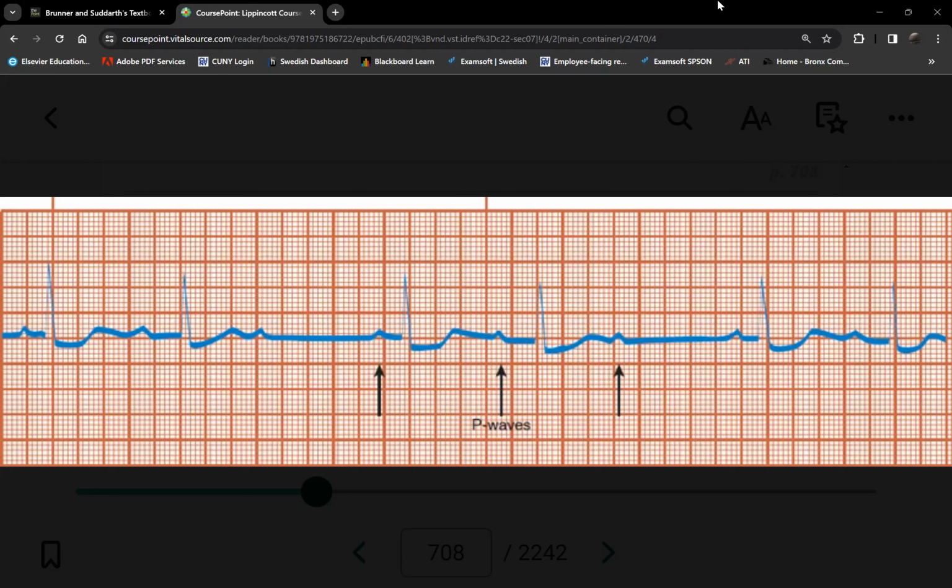See, this P wave here has no QRS. You noted that? Here, yes, prolonged PR interval, longer than 5 small blocks, and there's a QRS here. Long, even longer. This one went from 0.20, 0.22 to now 0.24. Right here, about 0.24 or 0.26, and even longer here. And then no more, I didn't show up. Right?